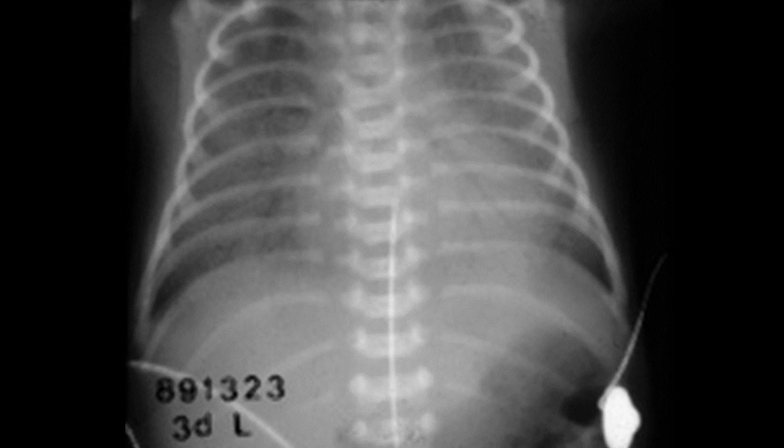A newborn preterm infant, born at 30 weeks, is struggling with breathing shortly after delivery. The neonatologists are concerned about respiratory distress, and so a chest X-ray is quickly obtained to help guide the diagnosis. As I review the X-ray, the first thing that stands out is the appearance of the lungs.